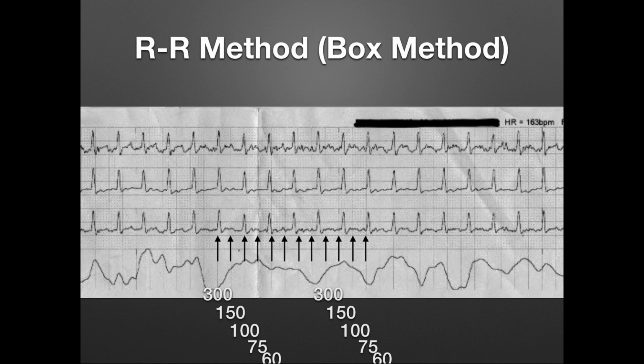So in this case, and I know we see the number right at the top right of our screen there, but let's go R to R. Let's identify which of these boxes would be easiest to look at. So let's go right around here. If we go to this box, that one almost lands on the line, and then we come right over here, and we know that there should be a line right around here, but this QRS complex comes right before it.